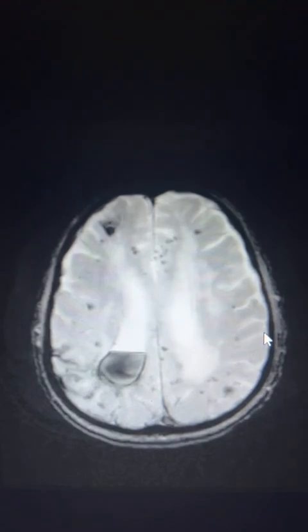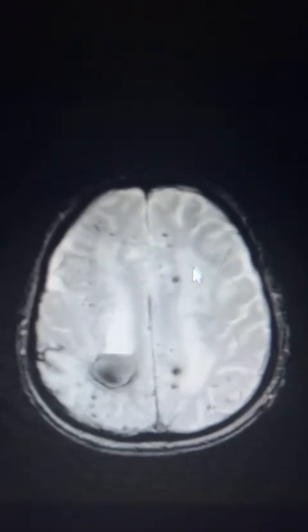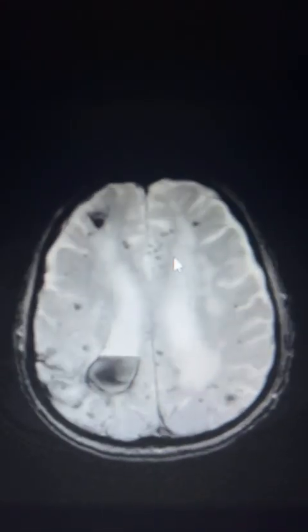However, what's extremely important in this case is to notice the other finding, which is represented as these dark multifocal areas that are scattered throughout the brain in the supratentorial system and the infratentorial components as well, such as the ones you see here. The most important observation when it comes to these small, tiny areas of low signal intensity on such sequence is to notice that they are peripheral in location. So they are cortical and subcortical.